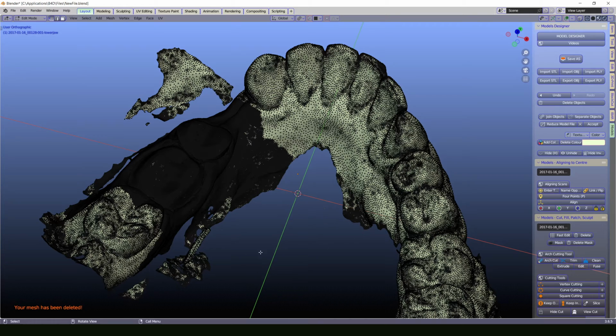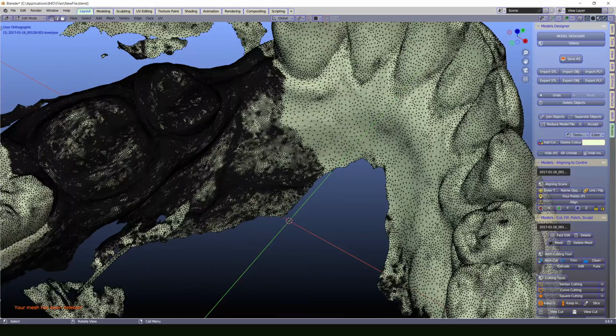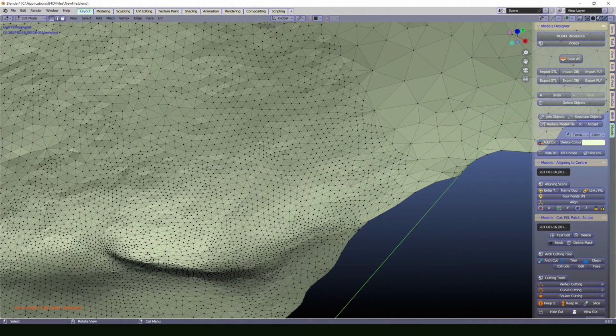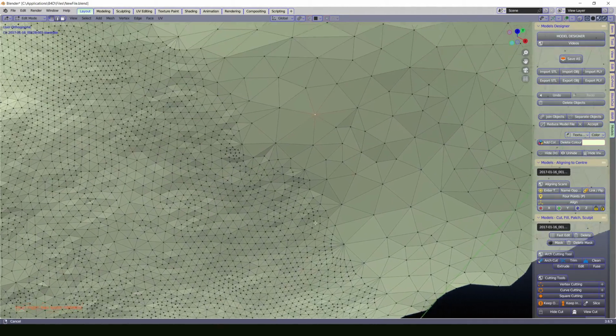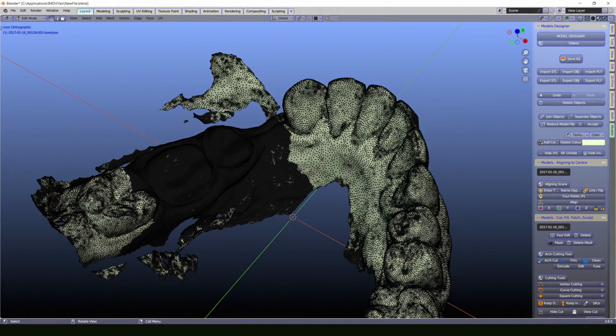You can see how dense the mesh of the preparation is. And now I go and select somewhere a point of vertices, a connection point, somewhere on the master file. So for example here, let me show you that. Just on that mothership, on that big main file, not on those flying around rubbish parts of the mesh.